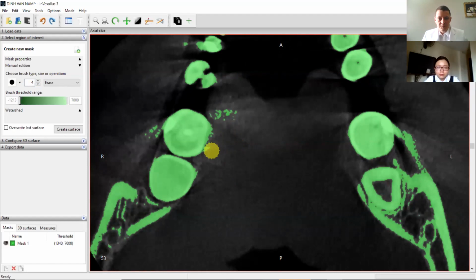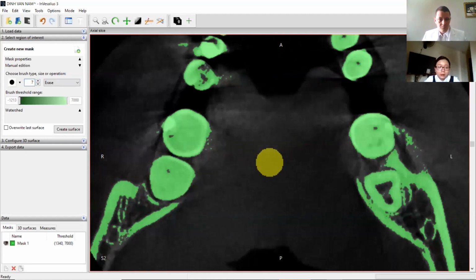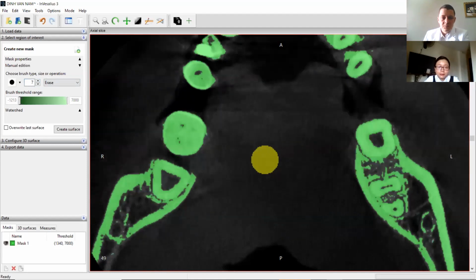Control Z, yes, because I checked a little too much. Nếu mà mình xóa lỡ tay mà xóa nhiều quá thì mình có thể undo bằng cách là mình ấn vào Control Z. Yes, Control Z.